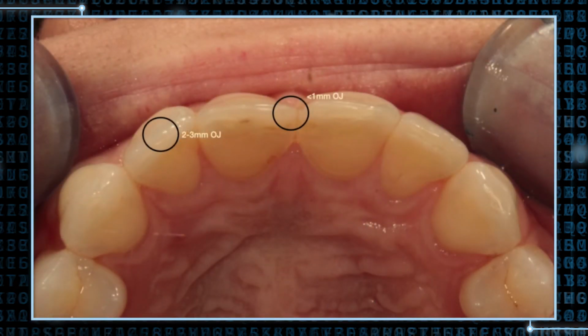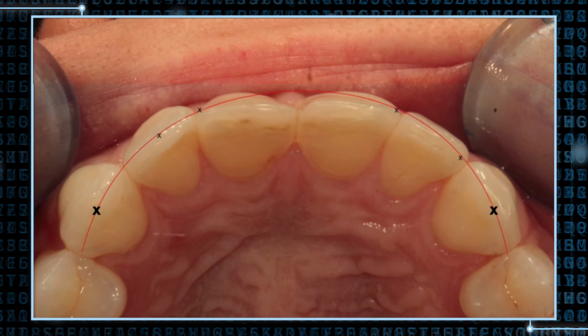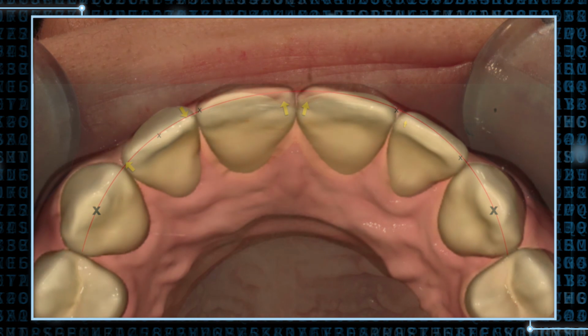So this was her, the position from the occlusal. She understood, and we knew the overjet was correct in that position and incorrect in the centrals. So these little marker points are points that I want to keep exactly the same and maintain through my treatment. So what I'm going to ask SureSmile to do is maintain the canines, only rotate that lateral, and then the centrals to hold the distal points, but basically mesiobuccally rotate those two centrals there. And we'll show you how we validate that using the SureSmile setup software.